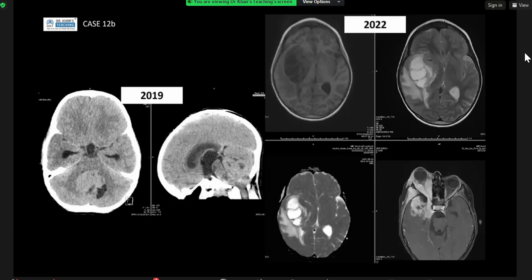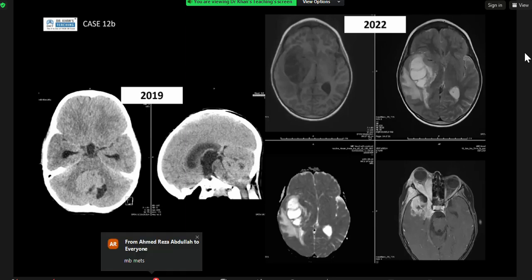Because you've got your hydrocephalus there as well. And again, posterior fossa thingies, you would think brain tumors first. And then if you start to see that in 2022, why have things changed? And things do look fairly dodgy, aggressive, with cystic components, although I didn't give you the full slices. Then when you look at the post-contrast one, the bottom right-hand corner, it's a lot of enhancement. It involves the bone, it involves the brain, there's proptosis. It just all looks very aggressive.